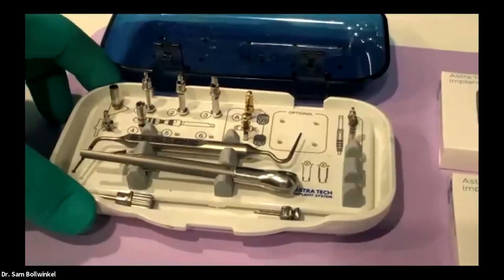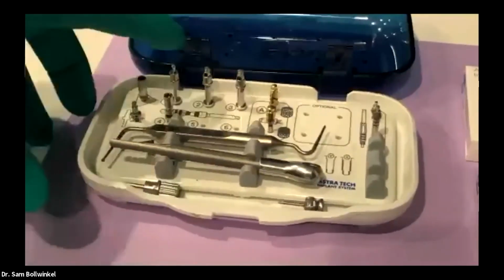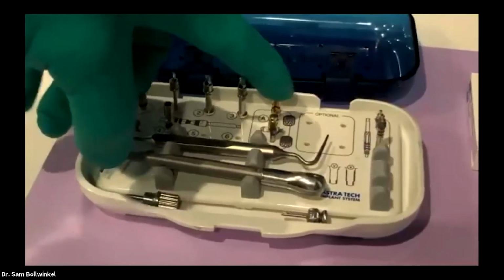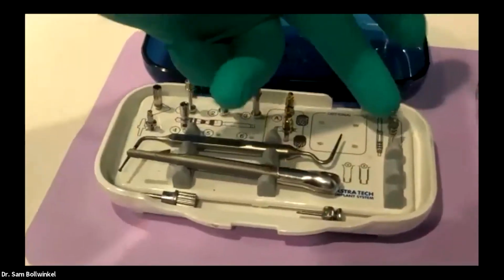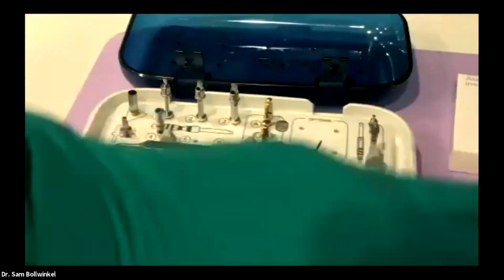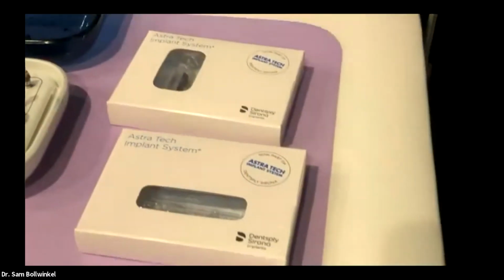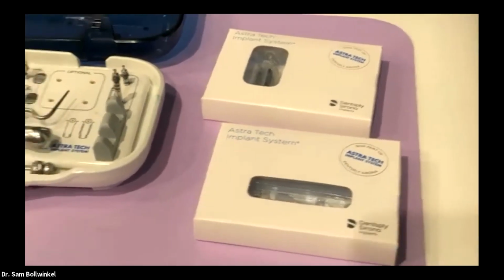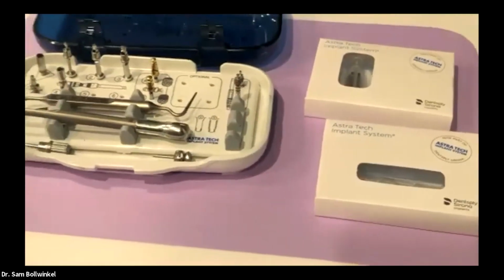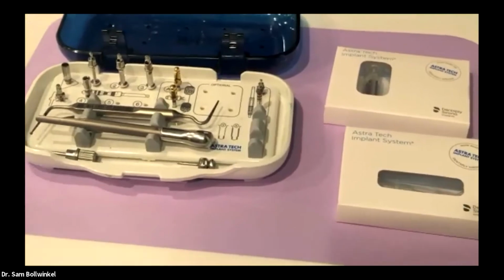Because we did it virtually, literally, we have a tissue punch, we have our osteotomy drills, we have a cortical drill that's going to create our flare for our conical implant. We have our driver, we have our implant and a cover screw, or an implant healing abutment screw. That is really all that comes to the table. So my team can walk through the plan, provide this.